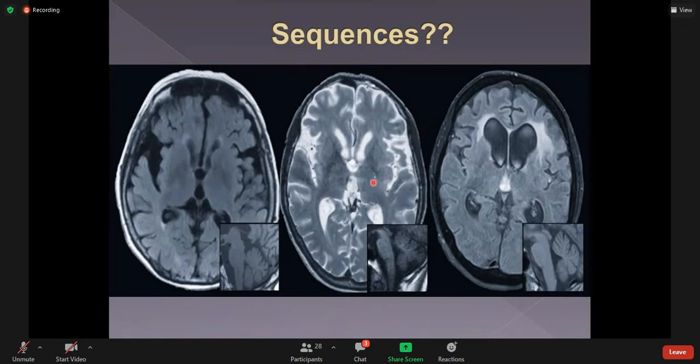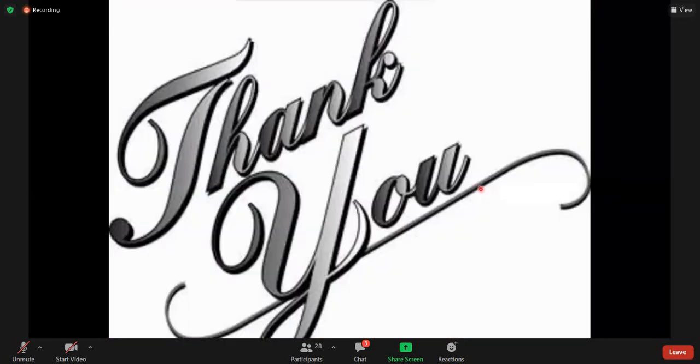So which sequences? This is FLAIR, T2, and this is also FLAIR. So thank you. If any query, there was just one question.